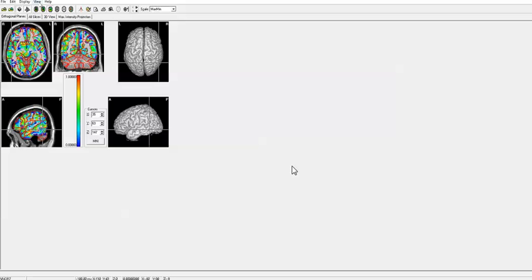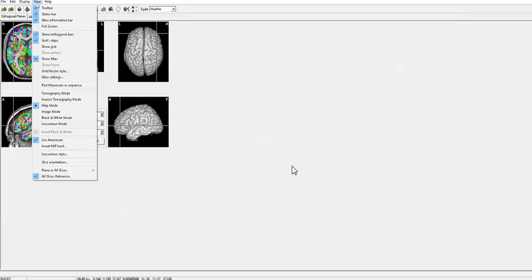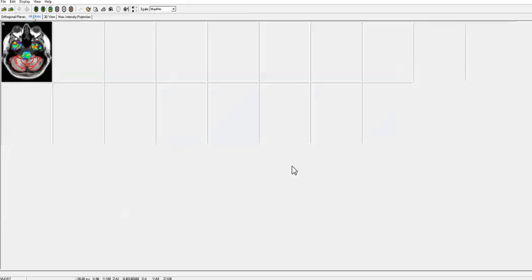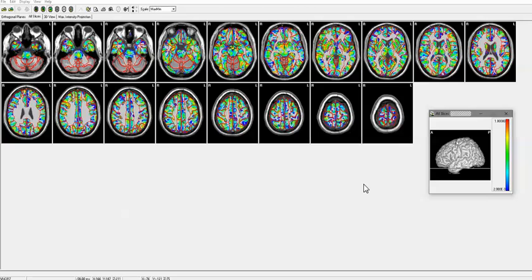Now here, that last view was the all slices view that you see in LORETA, the Key Institute LORETA. These are using the equations of what's called, as I mentioned, weighted standardized LORETA, swLORETA, but with 7mm slices beginning from the bottom of the head. And here we go with all the slices. On the upper left is the bottom of the brain, and all the way to the end here is the top. The outlines are Brodmann areas as you go from the bottom of the brain up to the top of the brain, and with the outlines of the Brodmann areas.